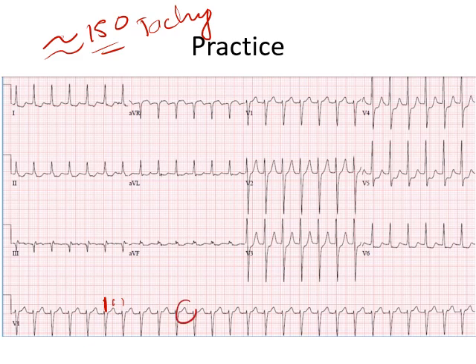These waves that you are seeing are T waves. Now remember, it is very uncommon to see absent T waves or flat T waves. So if you are seeing only one of them, only one of P or T, it is more likely to be a T wave, because absent P waves are far more common than absent T waves.